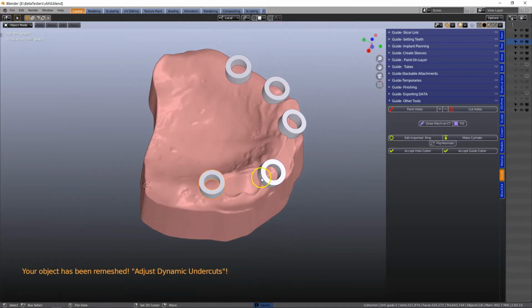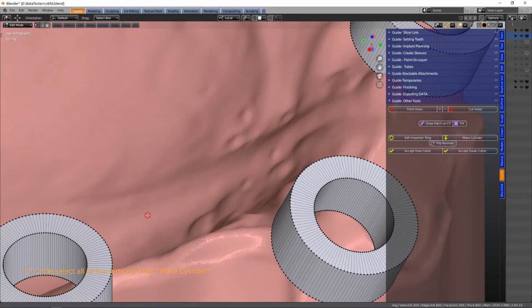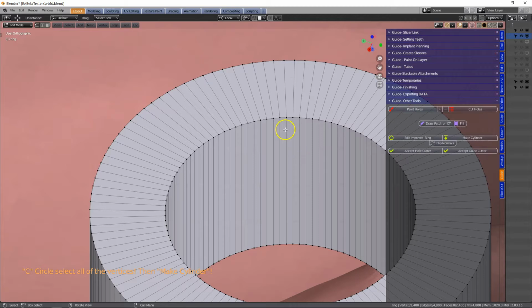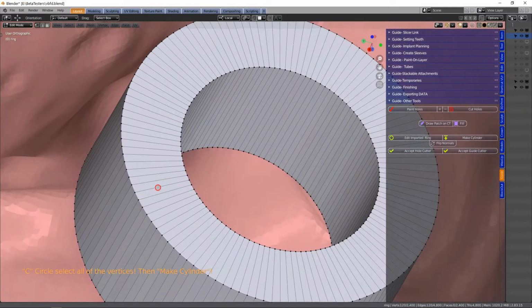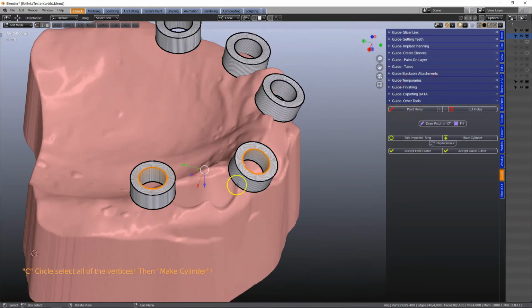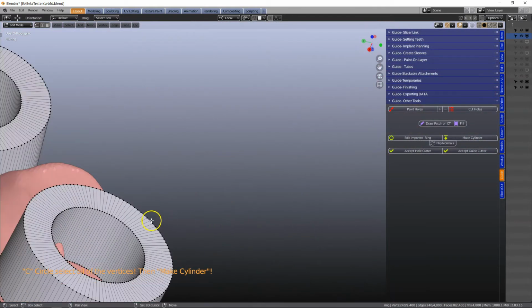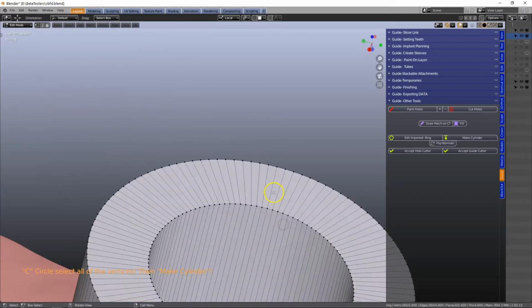Excellent. We're going to choose these. Edit imported rings. These are imported rings. I will zoom in very closely. Alt left click. And then this one would be Shift Alt left click. Next one is also Shift, which is to add to the selection, Alt left click.